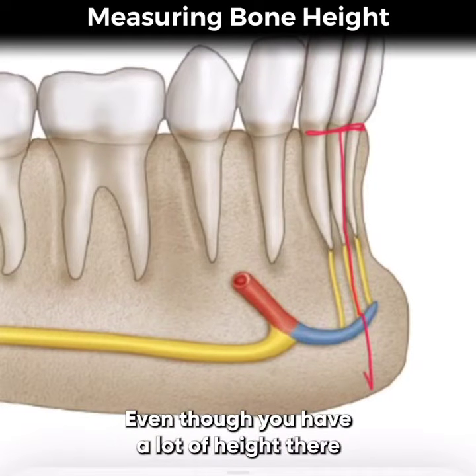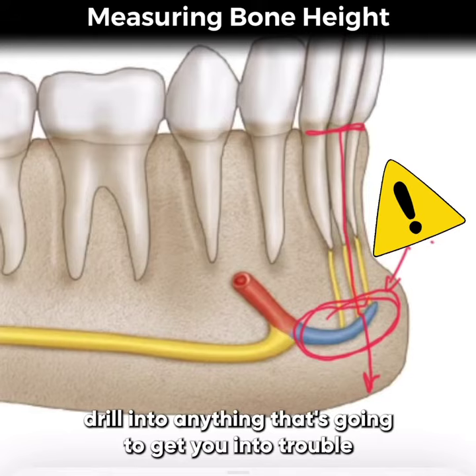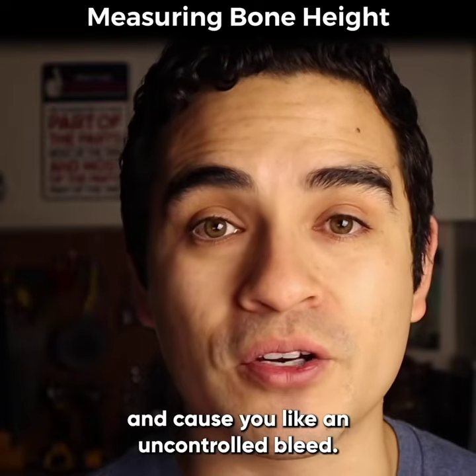So even though you have a lot of height there and you don't have a traditional limitation, you do want to evaluate that site radiographically to make sure you're not going to drill into anything that's going to get you into trouble and cause you an uncontrolled bleed.